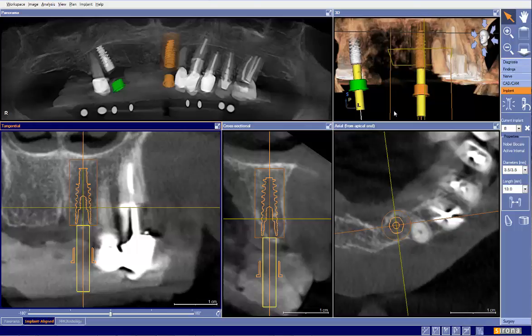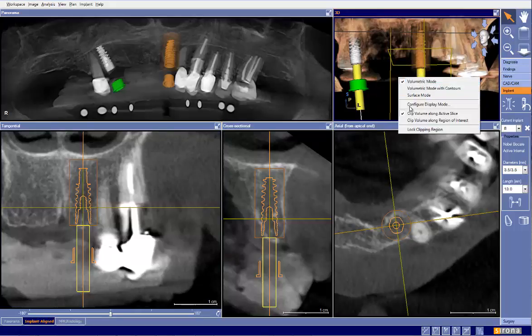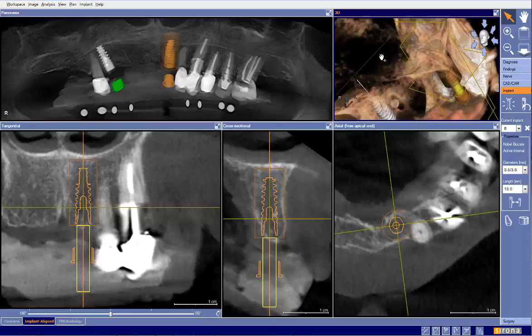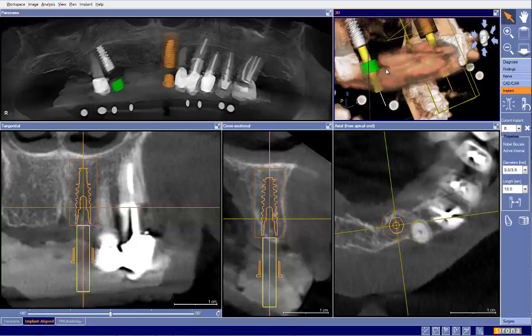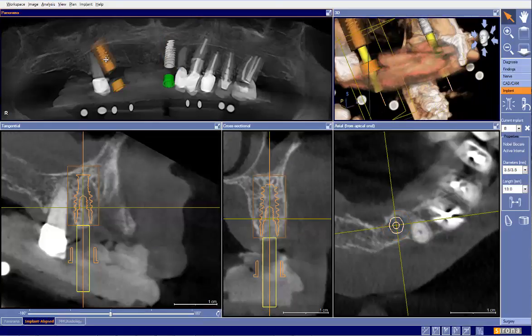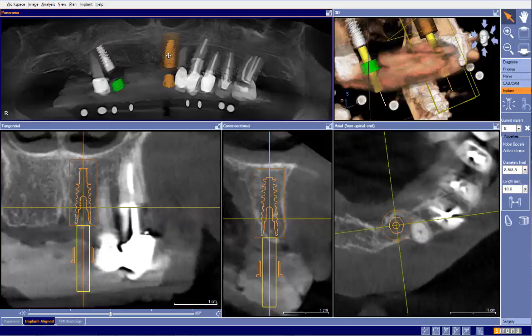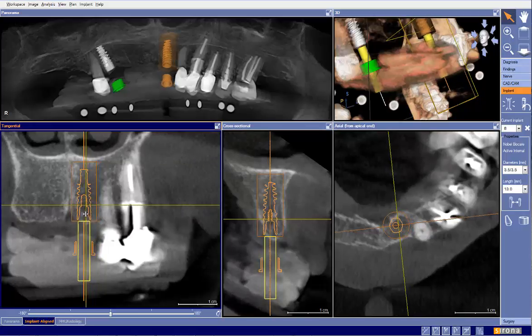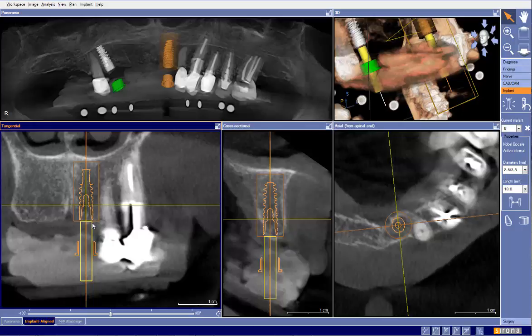I haven't really answered any of the major questions because unfortunately without the tooth information it becomes a little bit more difficult. But based on the plan, I would be quite comfortable putting this implant that we have in the 5-6 region, no problem. The number 9 region I question a little bit because remember we will have an abutment and then we will have a housing on there, and that housing may be too close or interfere with tooth number 10 here, requiring us to move this implant over a little bit, which isn't that big of a deal, but we just need to be aware of the size of these things when planning it. So let's get a little more information and we'll be happy to revisit this case. Thank you.